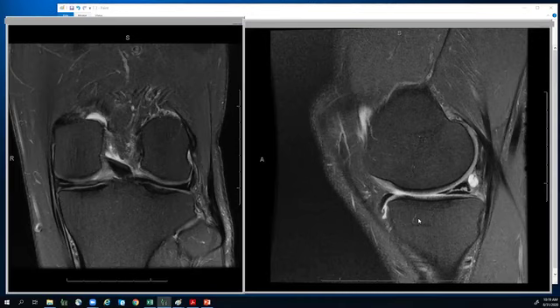All right, great. So we're getting some responses, and all the responses are accurate. We're dealing with a horizontal tear. The horizontal tear is surfacing inferiorly mainly, and it is associated with this parameniscal cyst, which is posterior to the posterior horn of the medial meniscus.